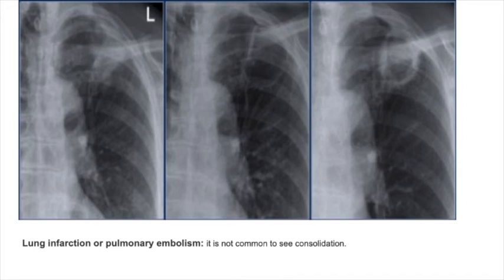But it's very difficult to make the diagnosis of pulmonary embolism. Mainly you look for a pleural-based opacity. You can see there is a cavitation there, but it's very difficult. I just bring it to the table to let you know it's very difficult to make this kind of diagnosis in any hospital.